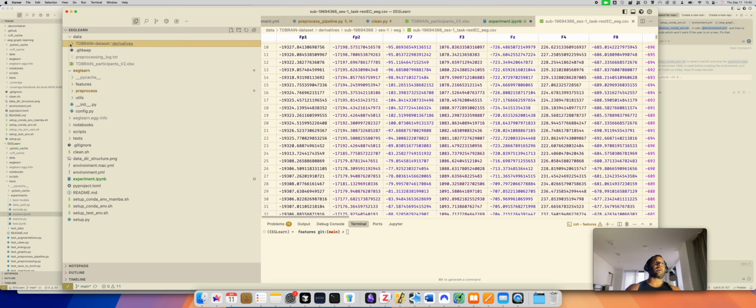So basically, the files are clean, and I'm just going to show you what you get when you do this cleaning process. So I have this little TDBrain notebook set up. I'm just importing one of these pre-processing files, right? Okay, so maybe the path has changed because it's randomly sampled. So I'm just going to copy this path. Yeah. So run that, and then this just shows you all the things you have.